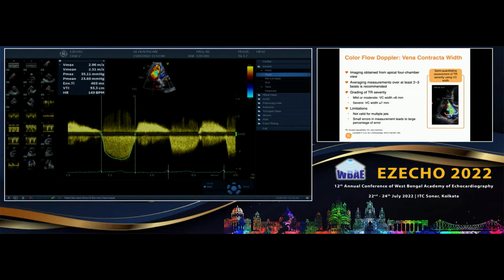Plus 10 or plus 15. It was about 2.1 and IVC was something like that, 45, 50. So it's very important in this case, particularly the assessment of the RV. It is a combination of both. But as you rightly say that there is a tricuspid pathology, so that is why this TR is not going to regress, even after correction of PH.